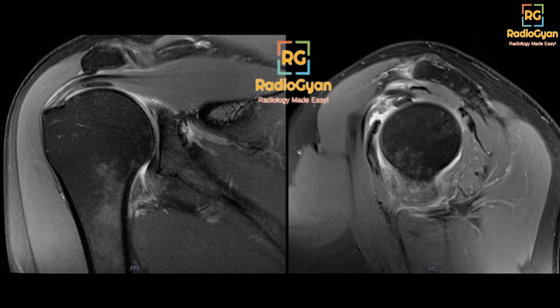Okay. Good differentials. So these are fat saturated water sensitive images. It's difficult to point out PD versus T2 fat sat, so I usually avoid the term. I find water sensitive sequence easier that way.